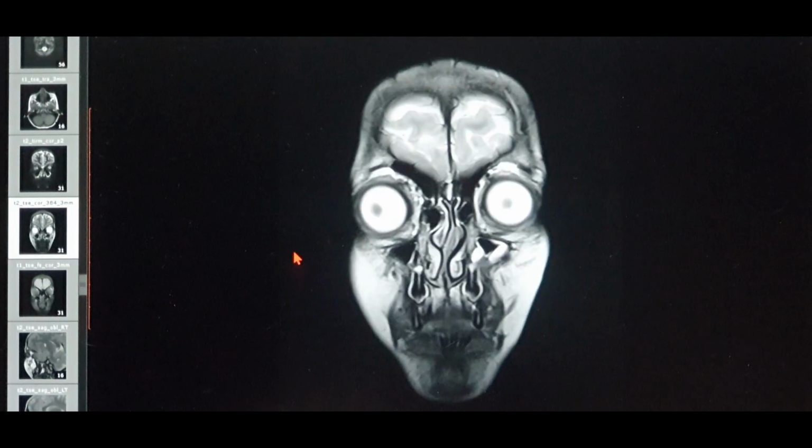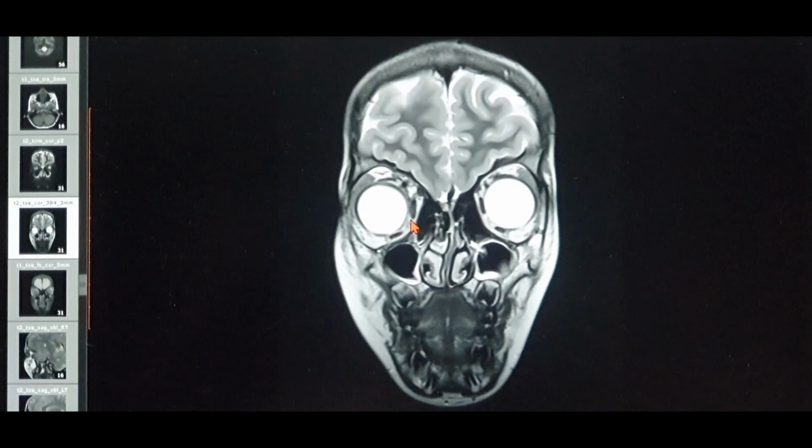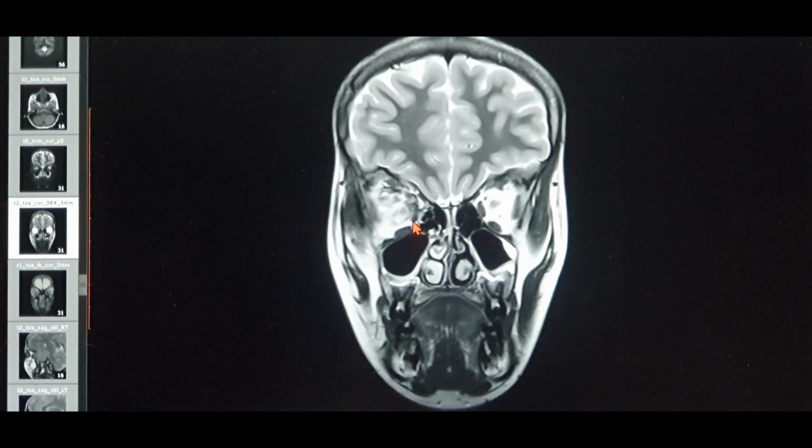I'll be posting a picture at the end of this video so that you can have a summarization of all the features of T1, T2, FLAIR, diffusion weighted images and T1 post contrast. How do the spinal cord, the CSF, the vertebrae, the base of skull, the brain and the sinuses look on the T1, T2 and various sequences? I'll give you a tabulated photograph at the end of the video. So keep watching the entire video to get the concepts very clear. This was all about T1 and T2 and the basics of other sequences.